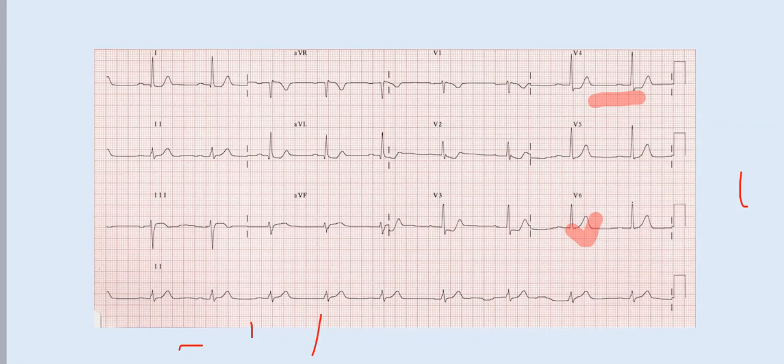طبعا posterior, it might come in context of inferior, and in this case, no big deal. يعني I already diagnosed the inferior quite clearly by ECG, no confusion. So if I have posterior extension or no, who cares? Patient is going for cath lab anyhow. المشكلة لما يكون عندك isolated posterior and no inferior. In this case, you can easily miss posterior MI. So isolated posterior MI is easily missable, okay?